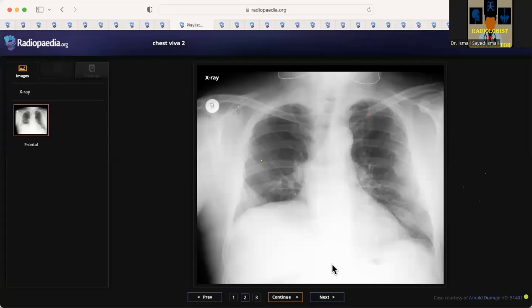If there is nothing, we'll alert the referring physician and arrange for a contrast-enhanced chest CT scan, with the main differential being a partial collapse of the left lower lung lobe. In an elderly patient, I will be worried about endobronchial lesions and malignancy. Okay, so there is nothing else, just for time reasons.